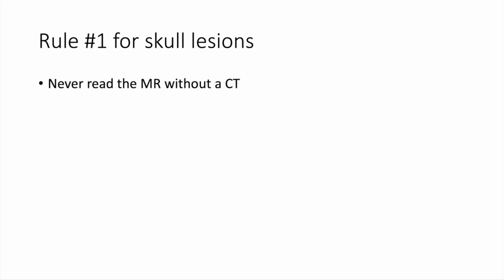I just have one question. Would you mind clarifying just one more time the key difference between the intraosseous meningioma versus fibrous dysplasia? Is it more the borders of the lesions, not so much the ground glass or the enhancement pattern?